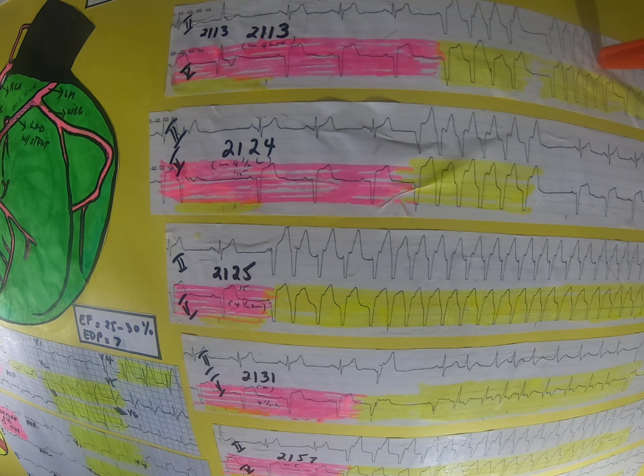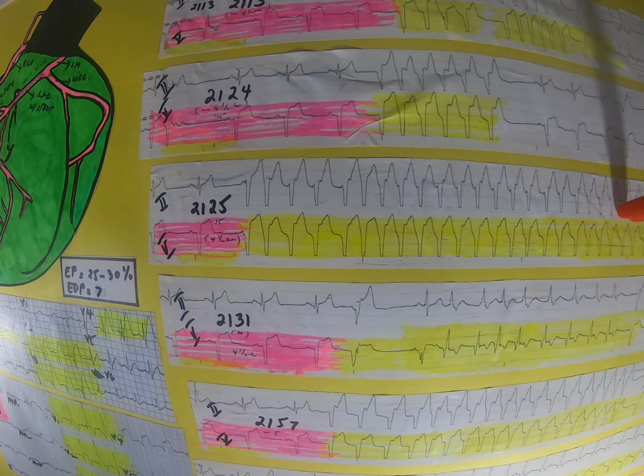Okay, next. We have here a sinus brady. We have here a short run monomorphic VTAC. Okay, the next one, longer. We have here a longer monomorphic VTAC. Okay, so these three, the patient is okay. Asymptomatic, no sign and symptom for this one. The patient is tolerating these rhythms.